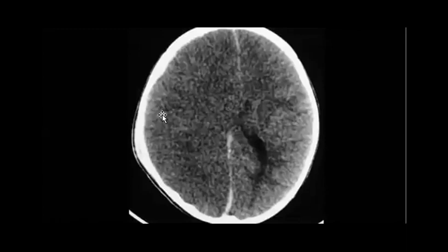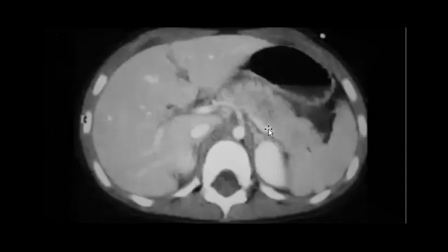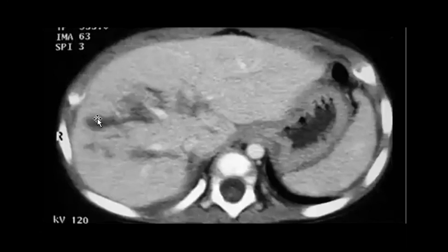Then all this criteria, not enough? Yes, not enough. Maybe you can find others. Like here, when you find a pediatric patient and you go through the CT of the patient and you find something in the abdomen. What is here? Hepatic laceration. Yes, you can find something going in the solid organs, including the liver or the pancreas. Like here is swollen. So the liver here has liver injury or laceration.